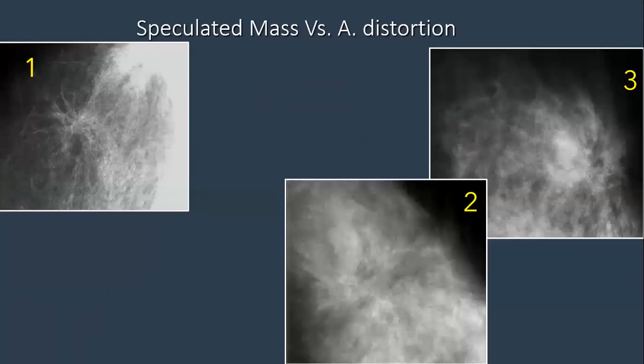Spiculated mass versus architectural distortion. Any volunteer who's going to take this case? Number one, is it a spiculated mass or an architectural distortion? Spiculated mass? Who is talking? You said what?